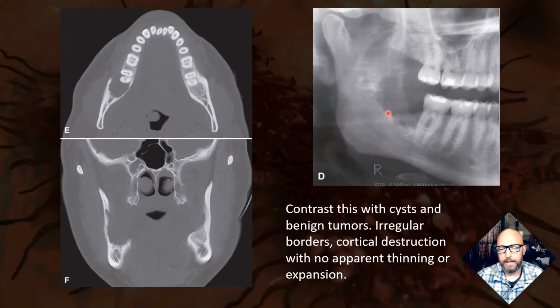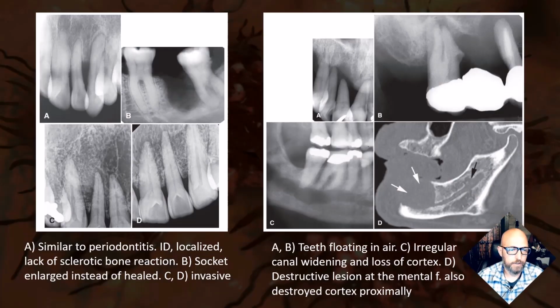An exception to that is a cyst or benign tumor. They can become infected, and those infective byproducts can resorb the bone around the lesion and maybe leave a ragged or ill-defined border. Usually it's not all the way around the lesion like this. And so you really should start thinking malignancy when you see that much of the lesion that has ill-defined or ragged borders.